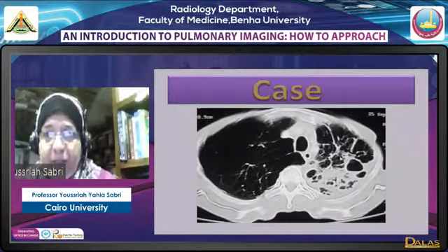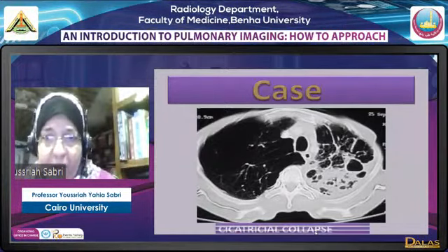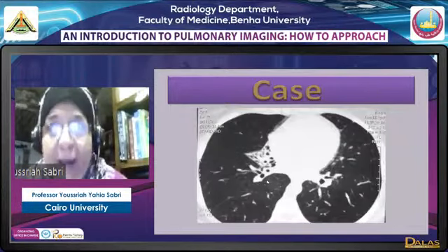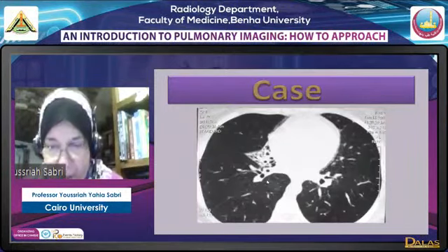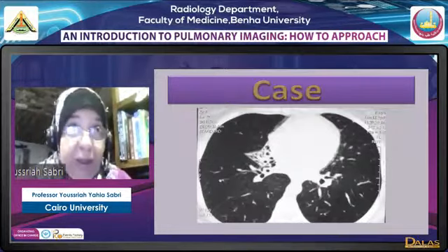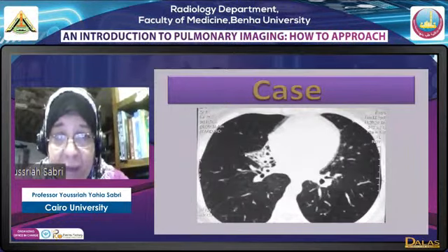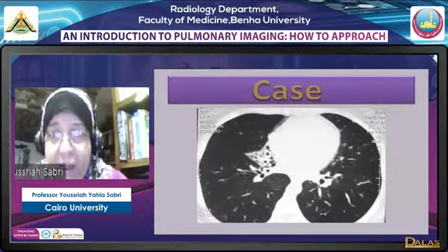Now coming again to this appearance of cicatrization in the upper lobe with shift of the mediastinum, and this is cicatricial collapse, okay, of the upper lobe on the left side. Same appearance in this triangular lesion. Now, when an opacity, whether fibrosis, consolidation or collapse, reaches a fissure, it becomes well demarcated by a linear or a curvilinear appearance. So we have demarcation here by lines, meaning that we are dealing here with fissures. Okay, so this is collapse.